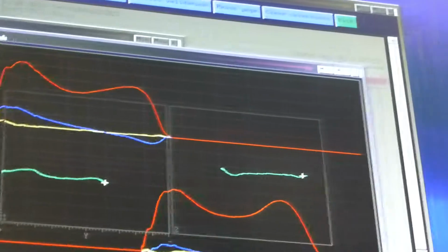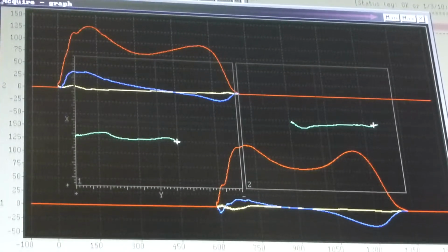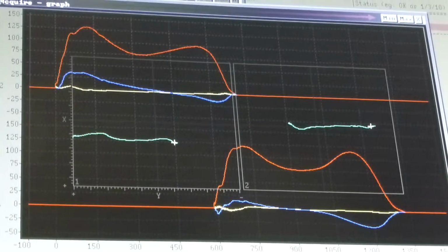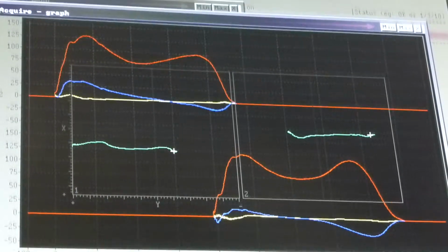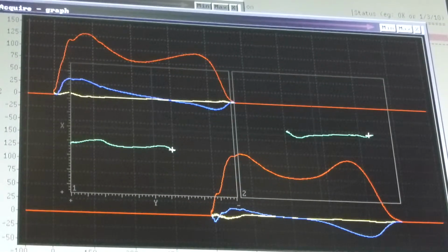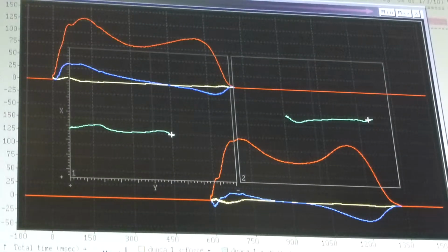It could, but here's where things get confusing. Down below where it names the trial, is there an asterisk there? Yes. It says force plate number asterisk swapped. Yep, they're swapped. So those numbers up there are actually backwards. It's only a display problem. So the left one is 2. It's confusing now, but if you had two graphs of two different trials overlaid and one was forward, one was reversed, then you'd see where it's useful because they look like they're going the same way.